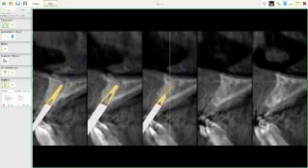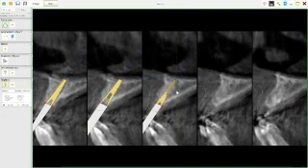And if I want to make this implant longer, because this is a 12, what I can do is if I move the cursor over the side of the implant, it changes from a pointer to like a little eye, meaning implant. If I click on that, I can actually sometimes stretch it and make it a bigger implant. So I've jumped from 12 to 15. And if you look down here, the length has changed to 15. So that gives me the option to do that. And now I've changed it to a 15. So let's have a little look.